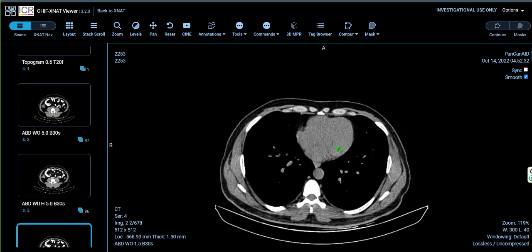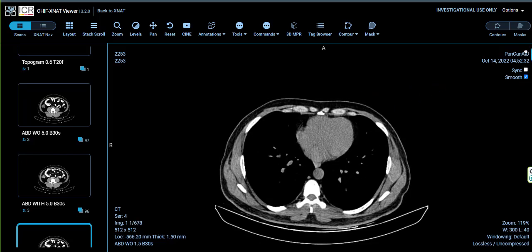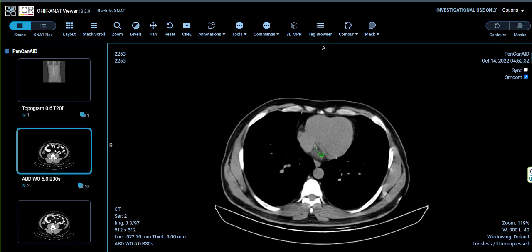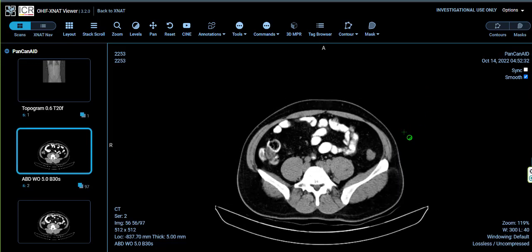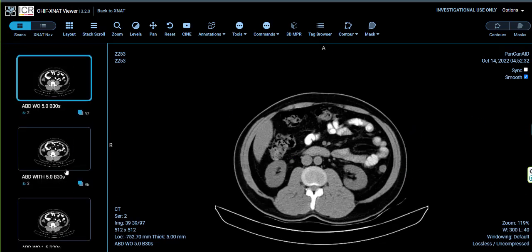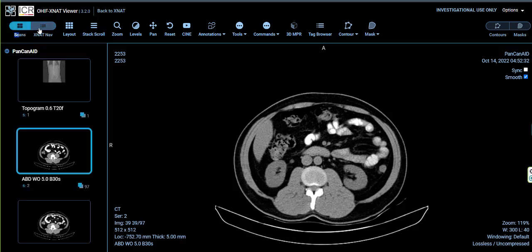So you can scroll down. As you can see, the speed of my server is not that bad for my context in Iran with this internet. It is amazing, and I am currently working on my server, so that's why I'm saying that my server speed is fine right now. So this is the XNAT client. You have the imaging series here. Let me first show you how you can see all of the images, so you won't need to go back each time to see the cases.